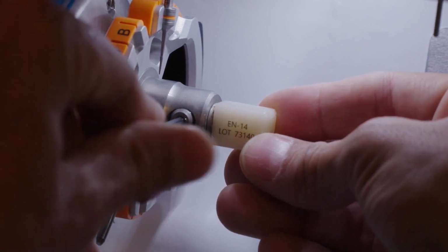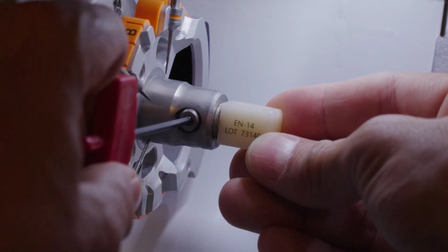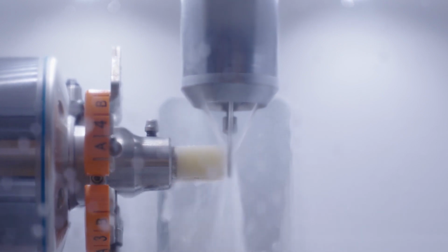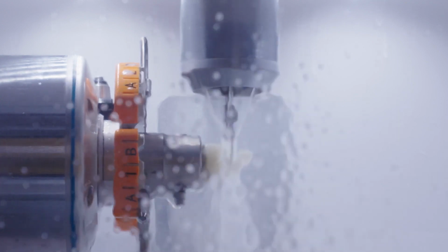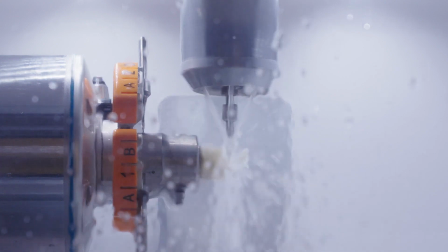A big advantage when milling the Edelweiss block is the low contamination of the milling cutters. Others very quickly glue the surface of the diamond cutters during removal and quickly deteriorate the result. Compared to other blocks, you can use the cutter up to 3 times longer, which means a significant cost saving.